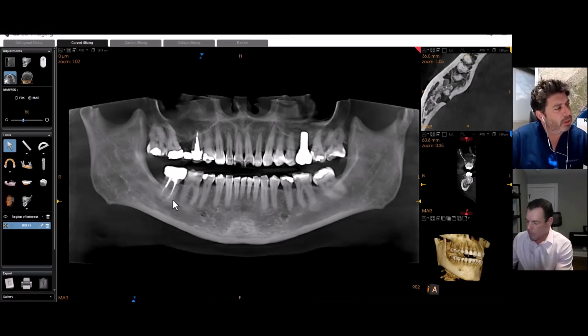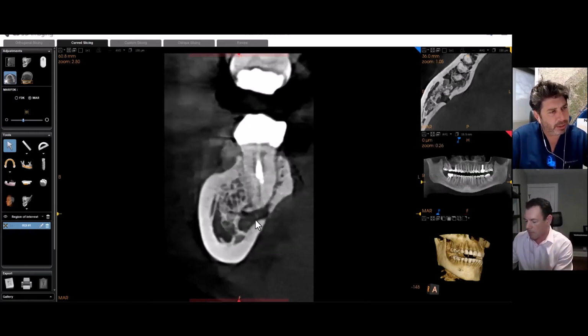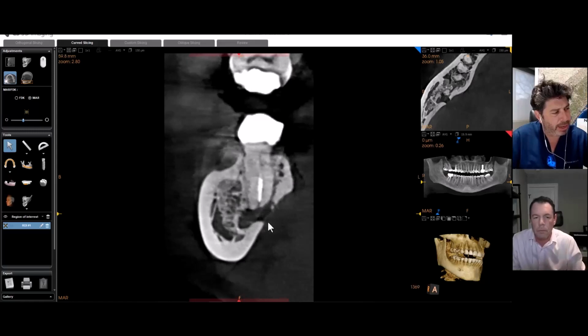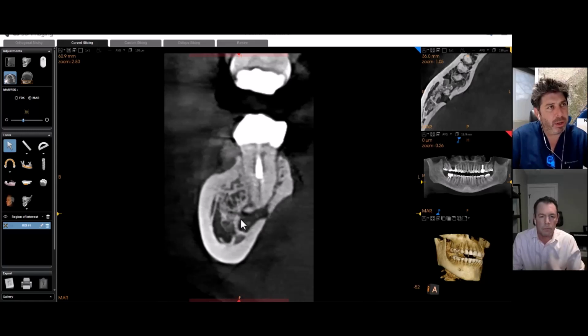But again, you're looking at a two-dimensional X-ray here, which does not tell the story, whereas this tells the full story. So of course, as an oral surgeon, this is a pretty standard thing for us. The tooth was extracted. All of this was cleaned out. We are concerned about the proximity of this periapical radiolucency to the nerve, but we were very careful. We placed an amniotic chorionic membrane over that nerve to wrap the nerve, and then we grafted bone around it. So the patient returned.